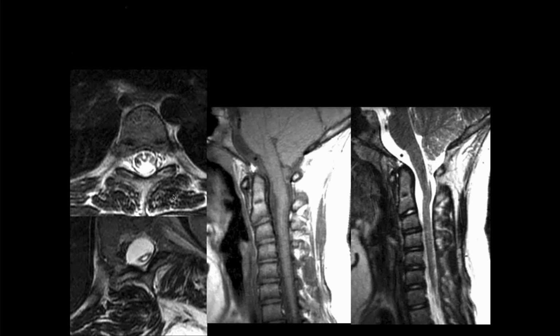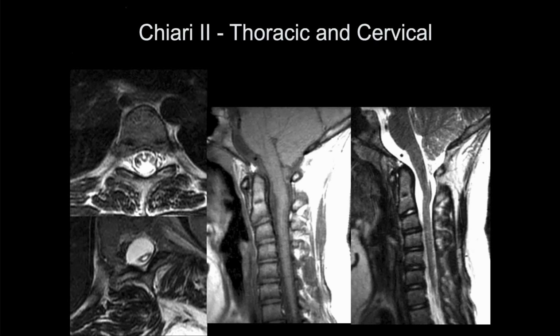And then this is the cervical spine for that patient. So what do you see here? Low-lying cerebellar tonsils, right, the syrinx. Yeah. And some cord atrophy. So this alone would be a Chiari 1, and then with the lumbar findings, it's a Chiari 2.